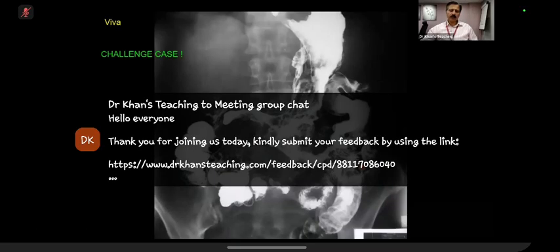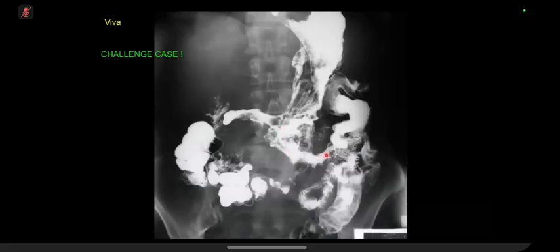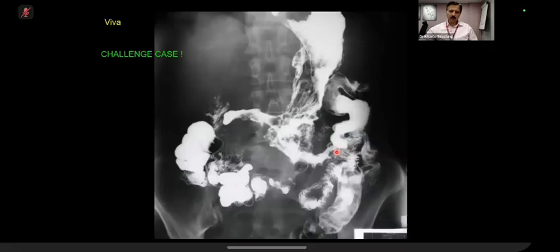They look slightly strictured, narrowed as well. Excuse me, well done, but can I stop you because of time factor? I'll ask you a question. What part of bowel is this? To be honest, I'm not really sure. It could be another part of the small bowel. They look like they're communicating with the stomach, which would be concerning for a fistula. Very good, well done. Please continue.